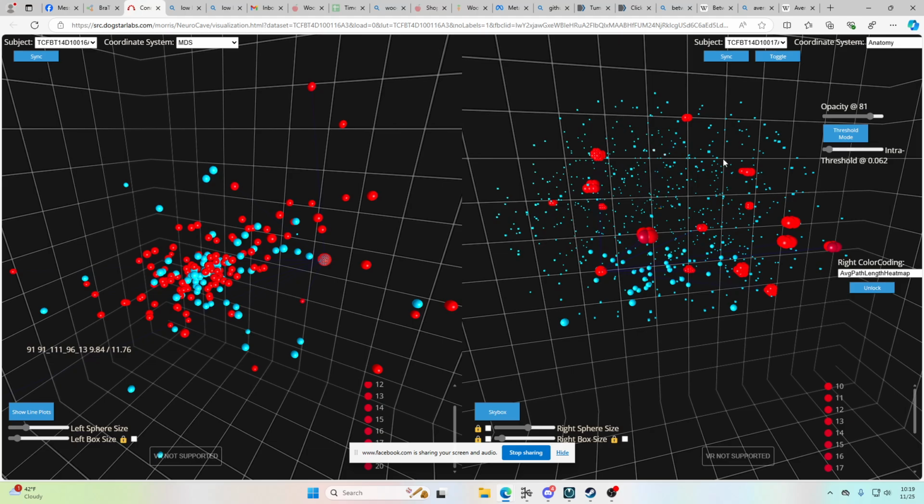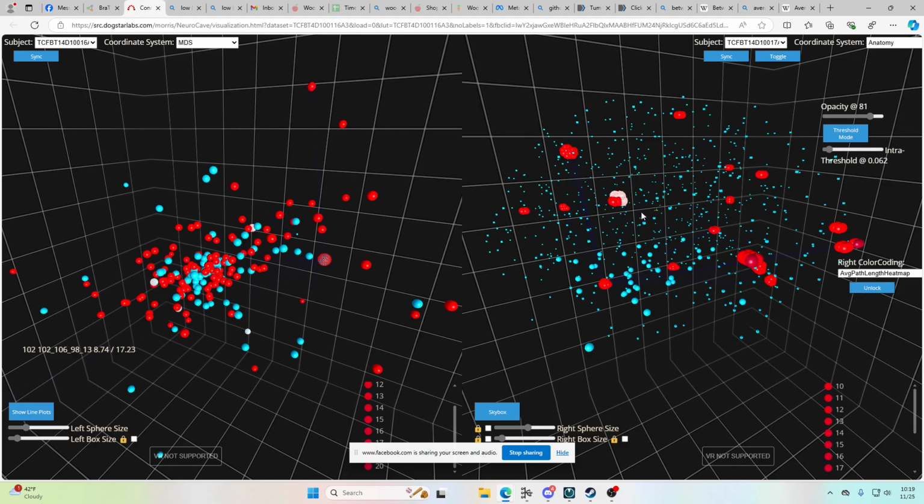And I'll be able to perform graph theory on the neural wiring and the evolutionary trees of the tumors, get an idea of how they interact with each other, and maybe get even better classification and even etiology research. Etiology being why tumors happen and how to make them not happen, or stop happening.